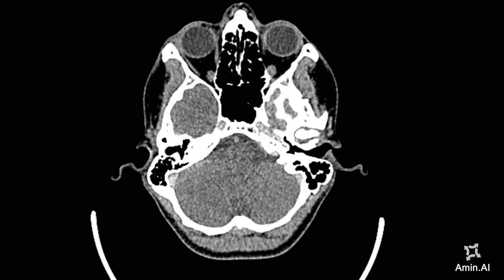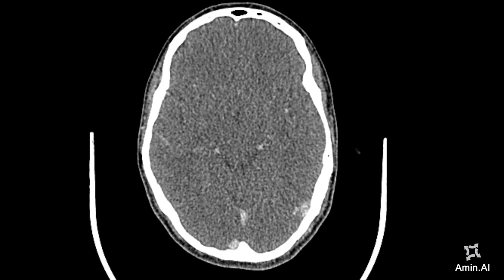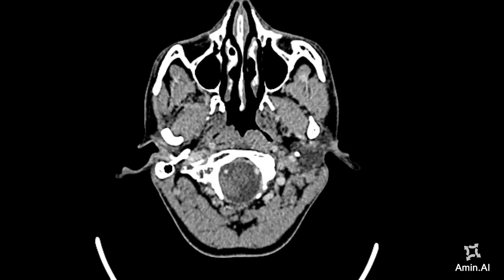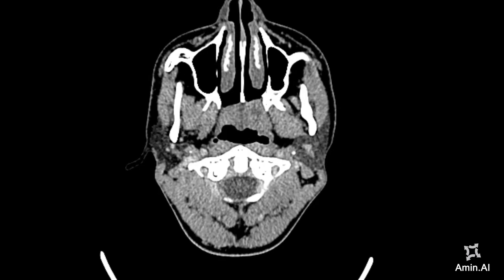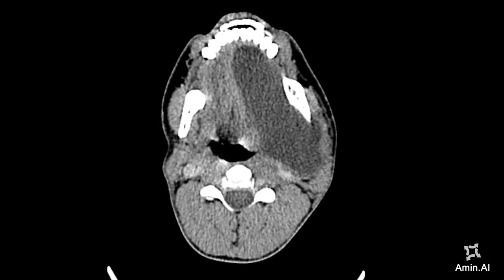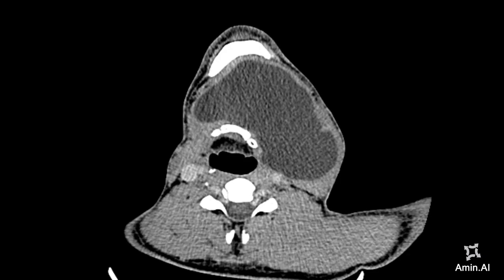This case is from head and neck, and this patient presents with left-sided cervical swelling. First I will browse the images so you can make an appropriate diagnosis. These are the axial post-contrast images of the patient.